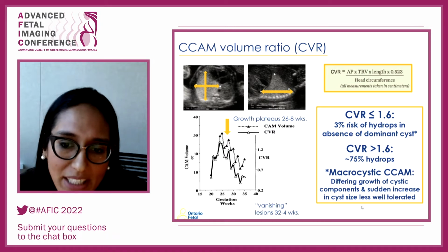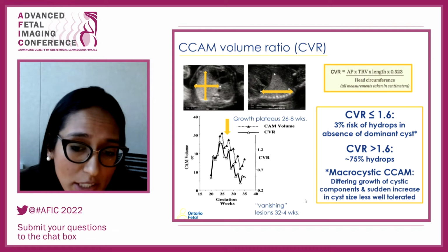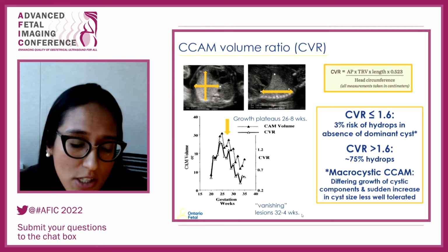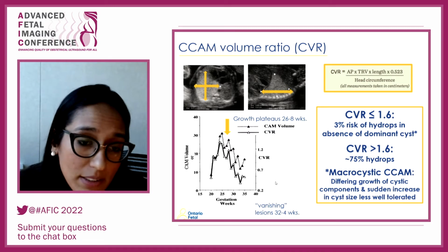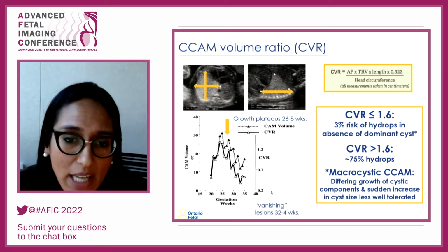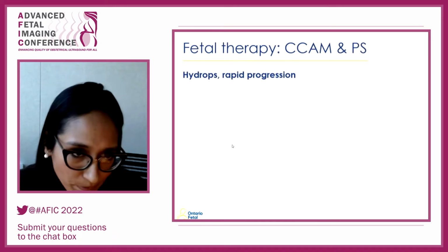The only caveat to this are the macrocystic ones, so the large cystic lesions, and even if they're not so large, because those small cystic lesions can also rapidly expand. So those ones we keep an eye on closely, typically till the end of the pregnancy, because sometimes it can be quite unpredictable in terms of their growth patterns and may need some kind of intervention.